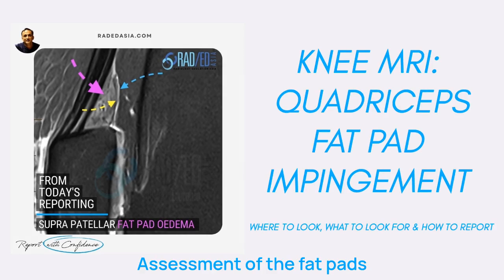Assessment of the fat pads around the knee on the MRI is an important thing to do, and you specifically need to look at them. So we have three fat pads. We've got the suprapatellar or quadriceps fat pad, we've got the supratrochlear fat pad, and then we have the infrapatellar fat pad. So today we're going to look at the quadriceps fat pad or suprapatellar fat pad.